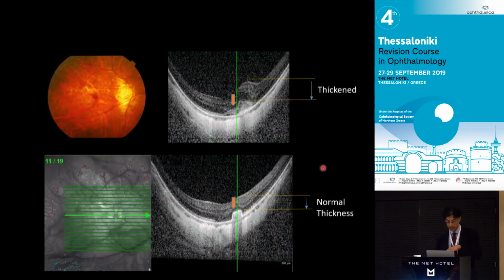And there's another example here. So this is a patient, I think it's quite some time ago, when we had just started getting Avastin. I think we're missing the first slide here. So the patient actually had the subretinal hyperreflective material, didn't want treatment initially, didn't like the idea of injections in the eye. Then the retina thickened a few weeks later, and the vision declined, then got treated, and you can see here the endpoint of treatment.